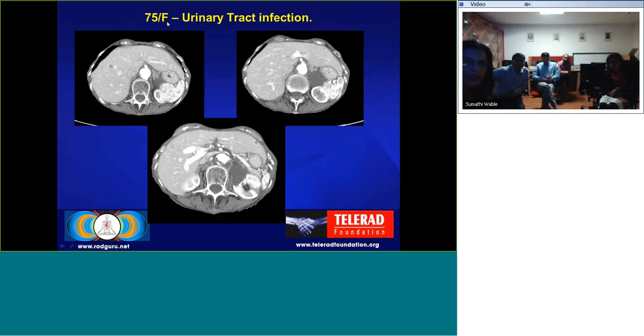In a patient who is 75 years old, I think there was evidence of colon surgery. Ring enhancing lesions are metastatic lesions. So that's something that you want to keep in mind. And I may be wrong. Like I said, I don't know the follow-up on this. But be careful whenever they're ring enhancing. I've seen these being called hemangiomas or whatnot. The one thing to remember is that hemangiomas are a broken ring.